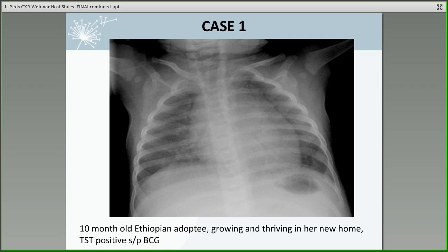Yes. The vessels in the hilar region are very small in infants. So often you can't see them. Plus they overlap, and then there's the large cardiac silhouette and hilar region. So they are very difficult to see. So what you're looking for is that extra density on the frontal chest radiograph, if you can. Great. Thank you.